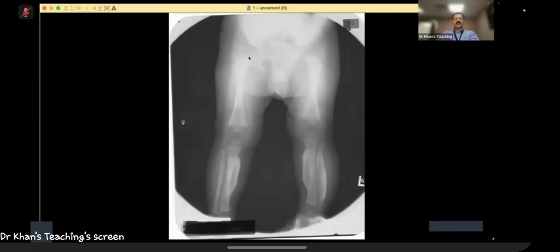In boys, it is 3 to 7 months, but there might be a subtle discrepancy in various sources. So generally speaking, in boys and girls, it will appear by 6 to 7 months at maximum. So this is a child which is definitely less than 8 months or close to that.